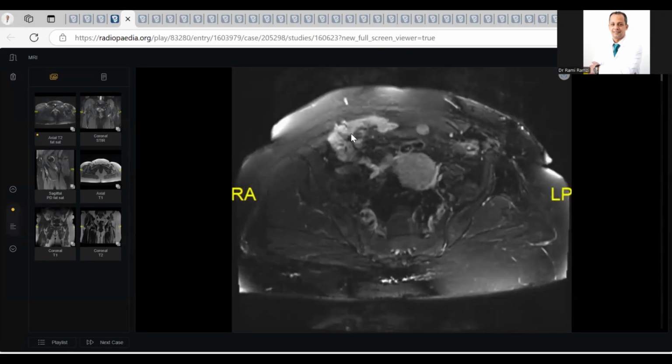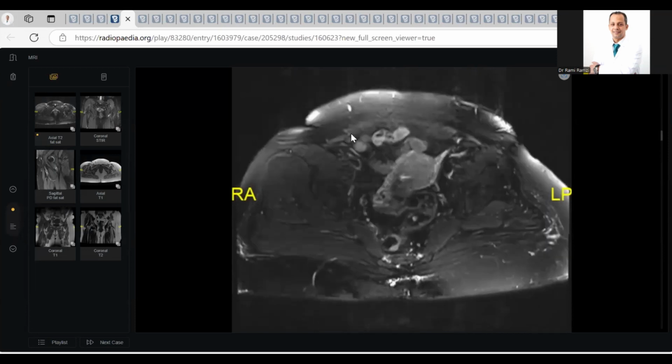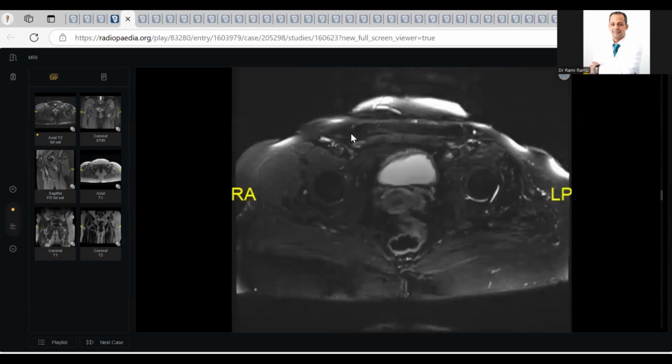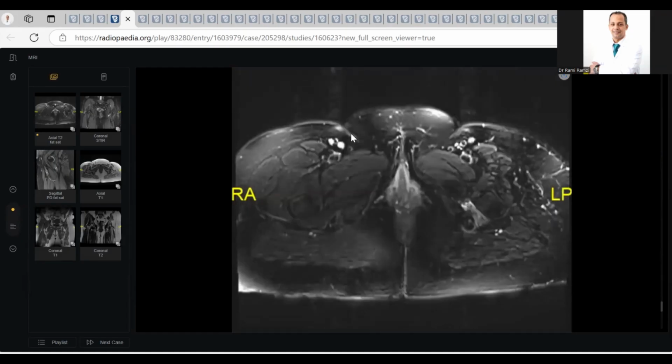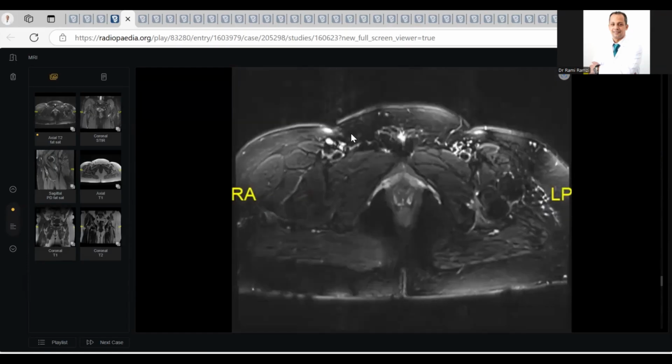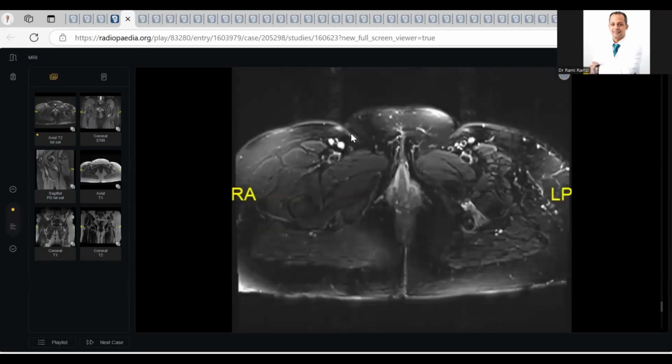This case, an observation case. Okay. This case has not too much pathology. There's just, you can start, please.